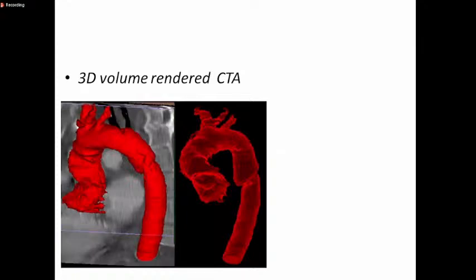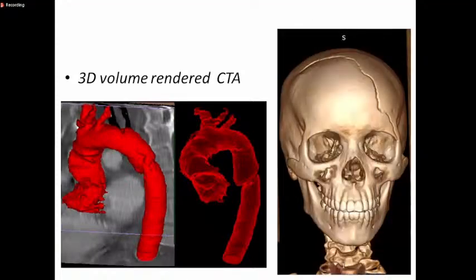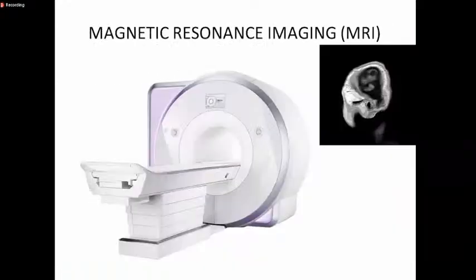This is showing an aorta, which has got coarctation. This is not necessarily neuro, but just to show you that this can be done. You can even color code. And I showed you this earlier. So this is a big advantage for CT now, which you can use.